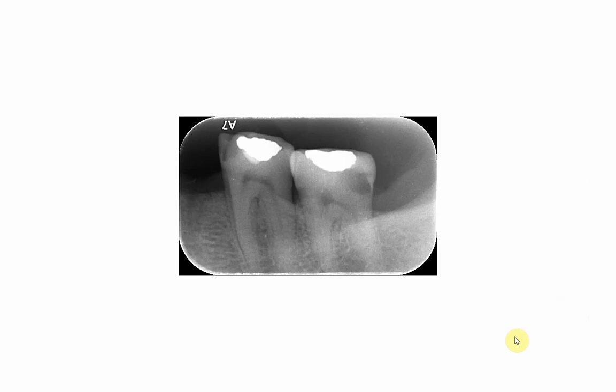Welcome again, everybody, to a new series of videos. In these videos, we are going to discuss the radiographic appearance of restorative materials that are used in different treatments of restorative dentistry, and how they would appear in the radiograph.